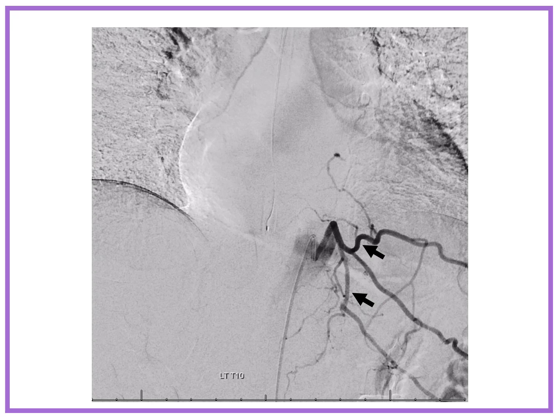Now here we see a good variant as well. We see from one injection we are opacifying all of these intercostal arteries, right? But this is more like a direct connection. It doesn't look like these smaller caliber anastomoses. You see the actual main artery caliber leading to the intercostal arteries.